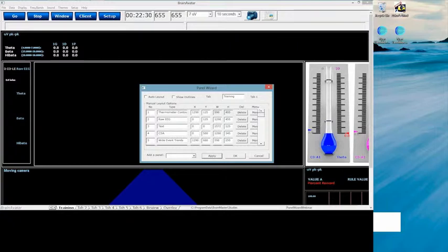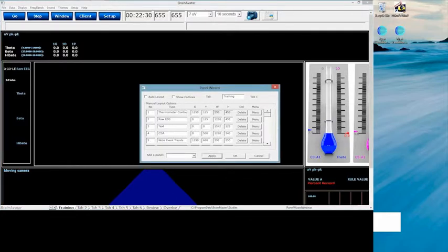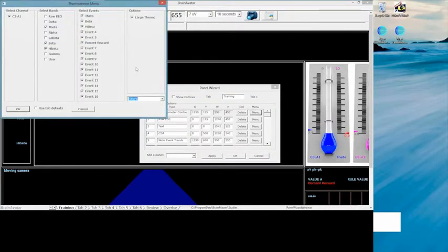So now one of the things we're going to notice is that before it was a perfect fit, it fit in this perfect square, and we're going to make this fit as a perfect square again. Because right now I have to drag down and go through everything. So the way I'm going to do that first is I'm going to go to my thermometer contours. And as you can see, these take up a big chunk of area right here. Well, now let's find out why they're taking up a big chunk. Now I'm going to go into the panel menu options. So when I go here, this is the example of the thermometer contours panel menu.